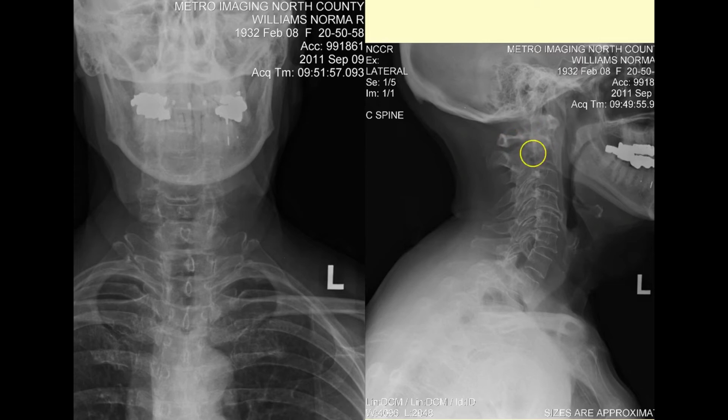Very, very important. And really the only good looking joint space we have is between C2 and C3. C3 and 4, 4 and 5, 5 and 6 are all narrowed. We lost the posterior disc spacing at 6, 7, and C7-T1 is starting to look pretty good again. Certainly there is posterior weight bearing and flattening of the lordotic contour for sure. So we can get a good idea about joint spacing and whether discogenic spondylosis is in place.